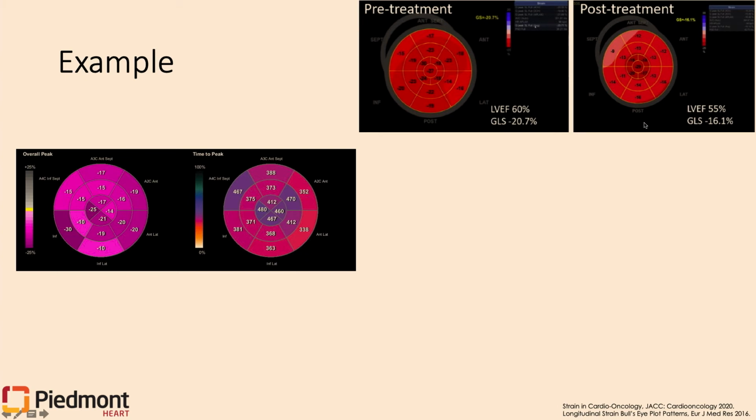So this is an example of a patient whose strain should perk your ears to considering whether they have cancer therapy, chemotherapy-related cardiotoxicity, and should initiate a dialogue between the cardiologist and the oncologist on optimizing this patient further to reduce any more cardiotoxicity.